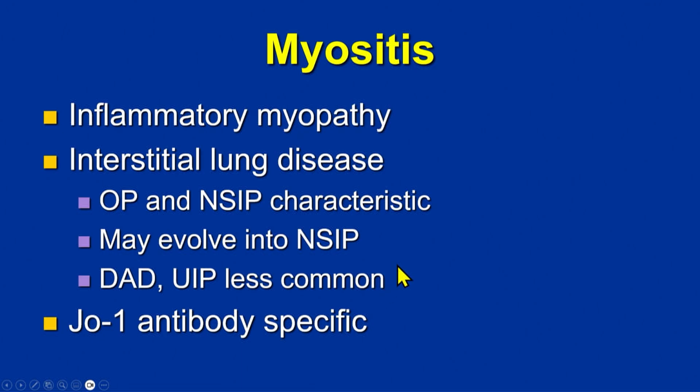So when you have these patients with systemic sclerosis, ILD, have your thinking cap on. Look carefully for slowly growing areas of nodularity, especially with convex margins that are increasing over time. All right, now let's talk about myositis.